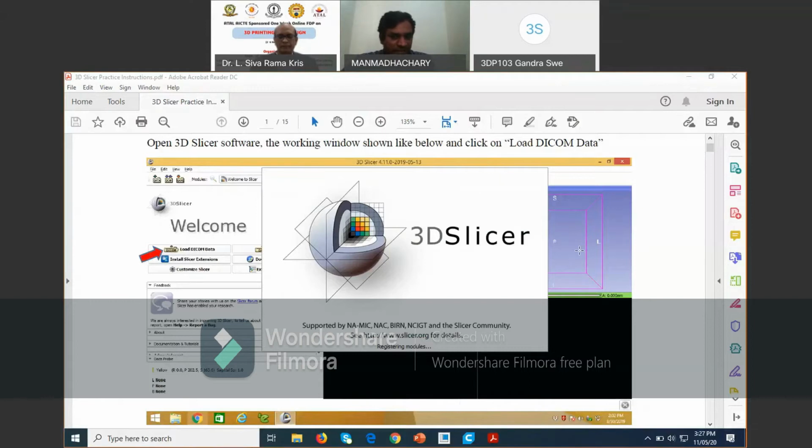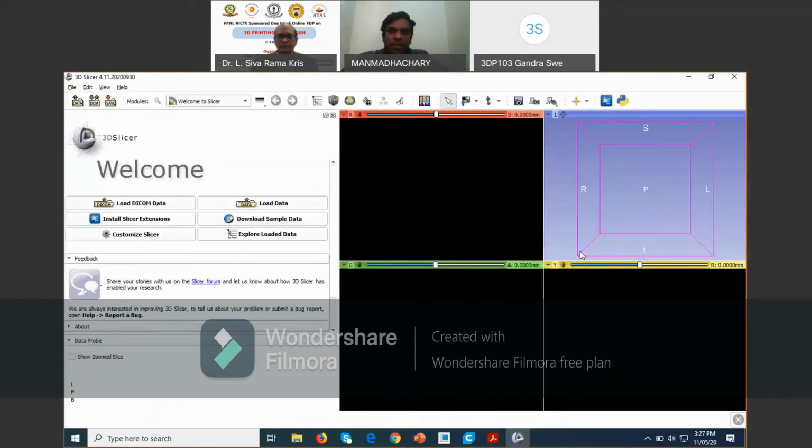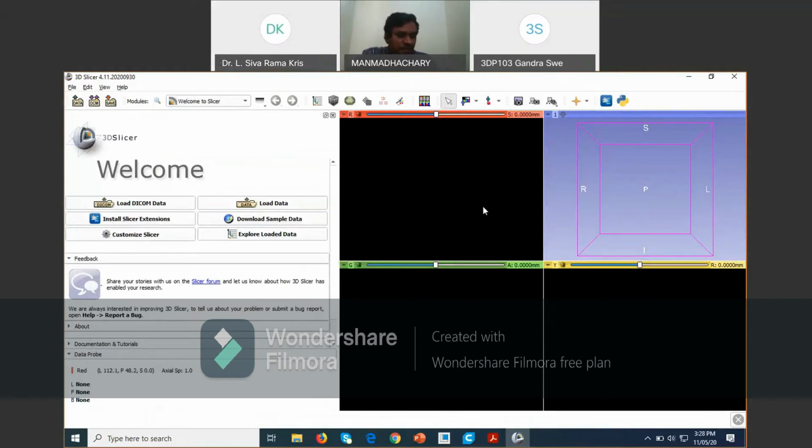Is it opening like this? Are you all ready? Will this window appear on your screen?